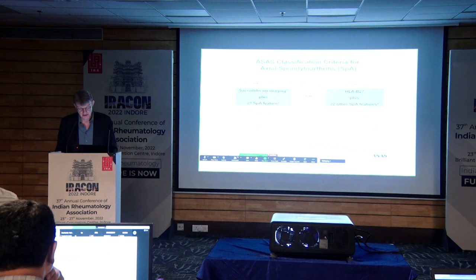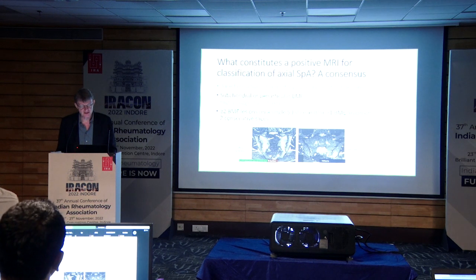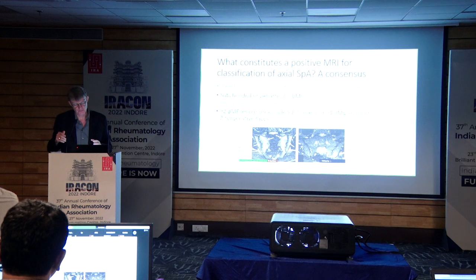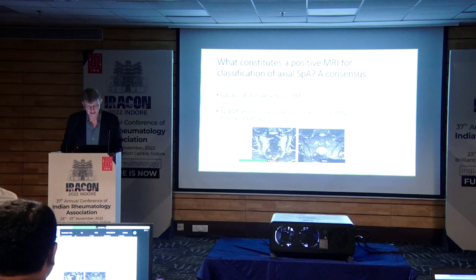So that's the definition, and thereby MRI suddenly had the opportunity to see things earlier than what you could do before and diagnose earlier. And it's very important that the MRIs need to be highly suggestive of axial SPA. And what is that then? That is an overall interpretation which will also take into consideration some of the differential diagnoses which may resemble it, particularly the lower end, like degenerative changes in stress and strain, which I'll come to a little bit later.